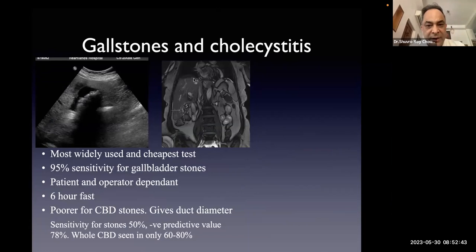So this is the liver, guys. Okay, this is the intrahepatic IVC. This is part of the aorta. Okay, these are loops of bowel, spine, psoas, and this is the intra-abdominal fat.